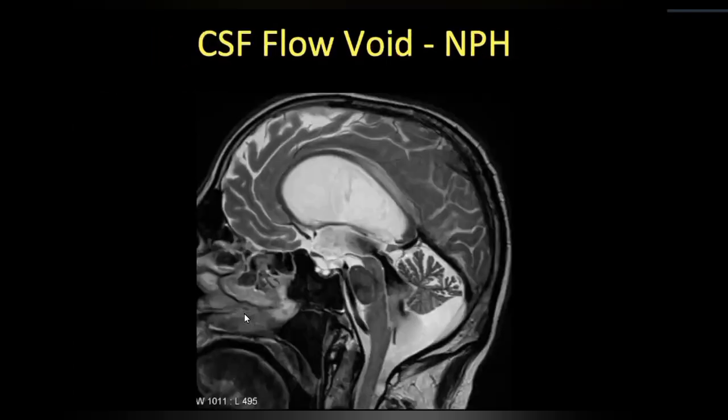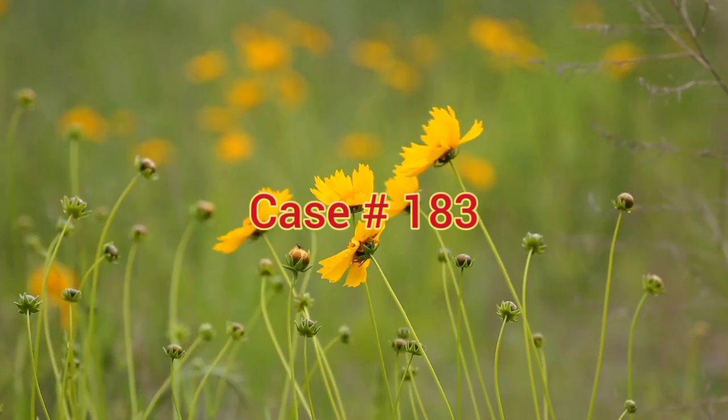Other thing, if you do the routine T2 weighted images, you will see a hyperdynamic flow. See here is the CSF. It should be bright like this. Why is it dark? It is moving very fast. It's like a hyperdynamic flow. So whatever points to effacement of the sulci at the vertex and a narrow callosal angle, that will be our NPH.